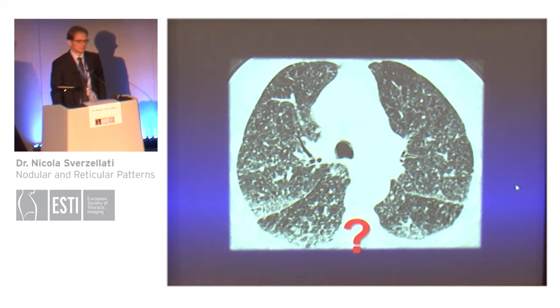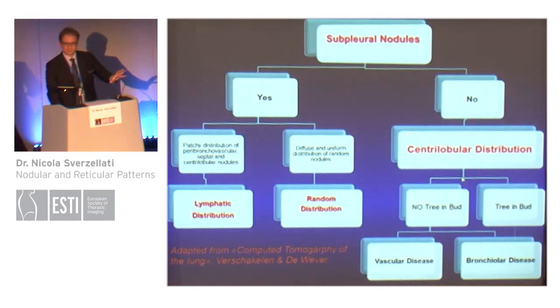So we should consider clinical information, clinical findings, and check carefully all the lungs for the presence of consolidation, which may represent, for example, lung cancer in these ambiguous cases. So this is a very simple diagnostic algorithm which improves the evaluation of the nodular pattern.